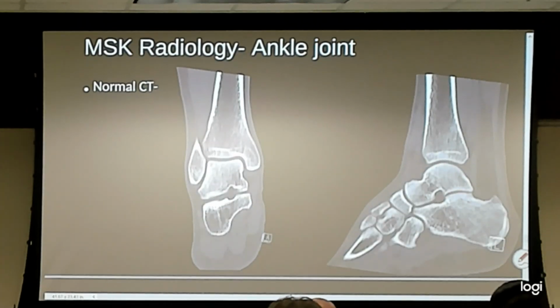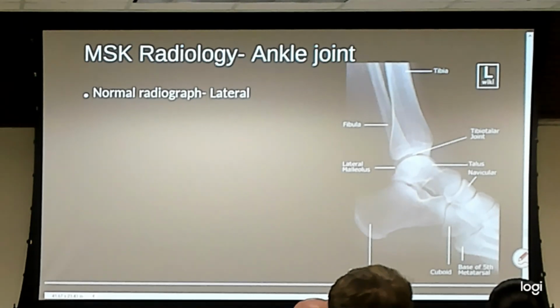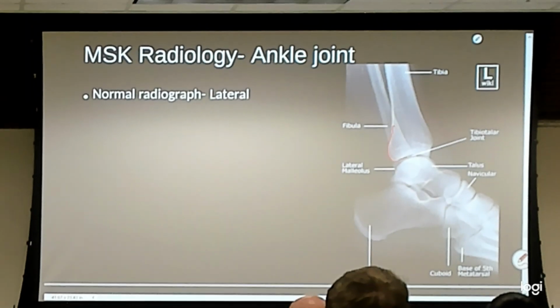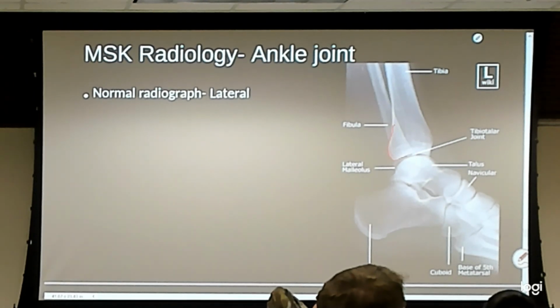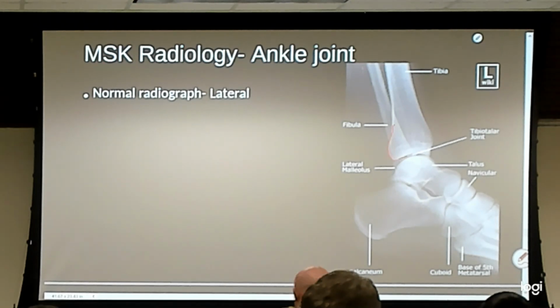Okay. Yep, I'll show it again. I'm sorry, I missed it. It's okay. Okay, so shiny object syndrome happens here. So this border here is the most obvious part of it. There is more to it. I don't know if this guy has a good posterior malleolus. Not particularly, but if you want to come look, his leg's an okay approximation. There's a lip that extends a little more inferiorly, but finding it is not critical at this juncture. It's somewhere under the end of the line that says lateral malleolus.